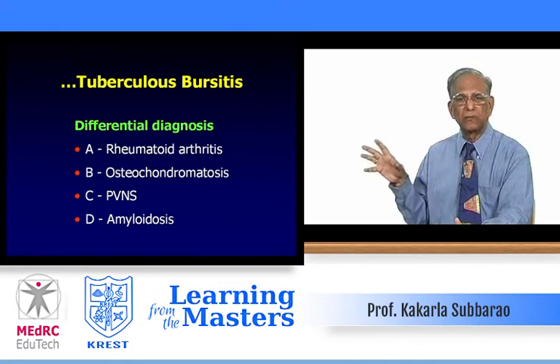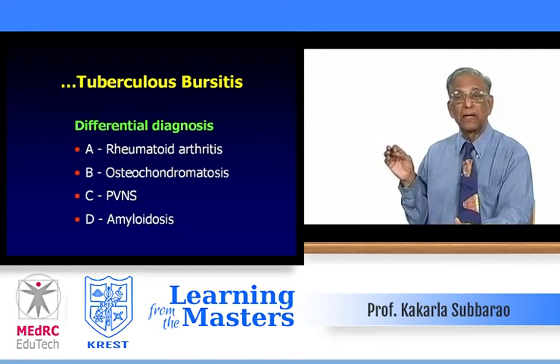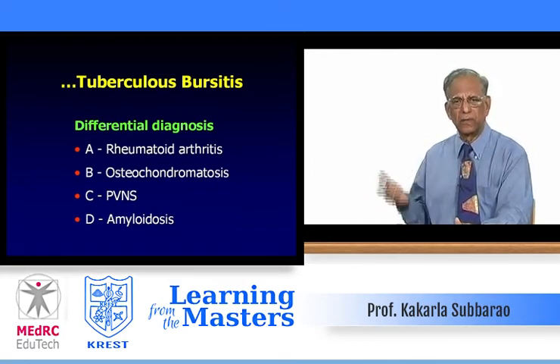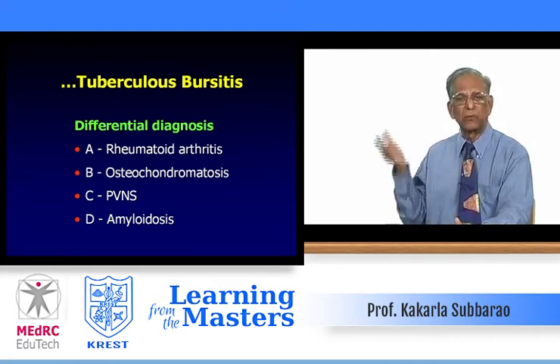Here the bone is not involved. Often in pigmented villonodular synovitis, apart from the soft tissue swelling, adjacent bone may be eroded, the adjacent articular margin may be eroded. And then of course amyloidosis. At this young age you don't think of primary or secondary amyloidosis, but there is no osteoporosis in plain films, and no bony lesion actually.